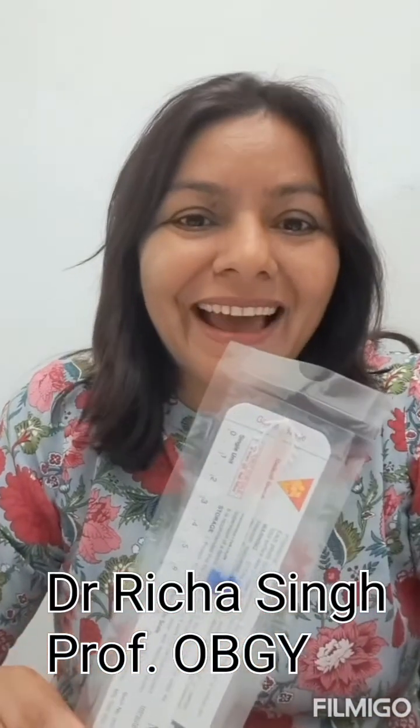Family planning viva: one of the important methods of contraception is the IUCD, or intrauterine contraceptive device. Normally, the examiner will give you this and would expect you to speak something about it. If you see closely, this is a multi-load copper-T. So some copper-T is handed over to you, and they want you to speak about it.